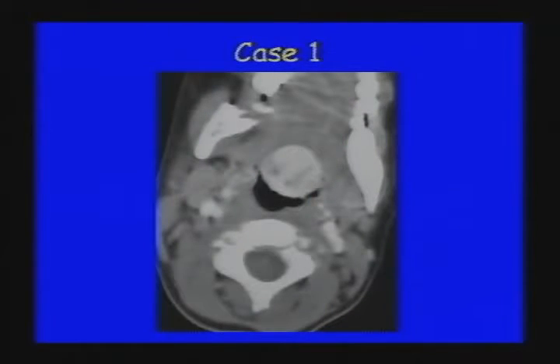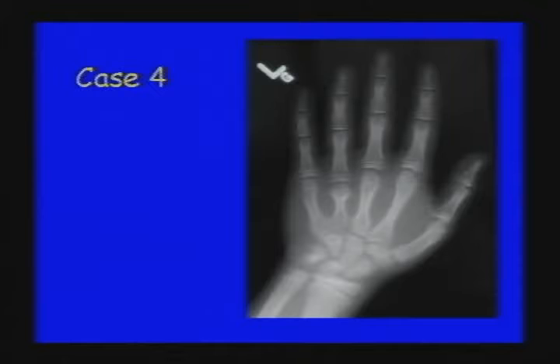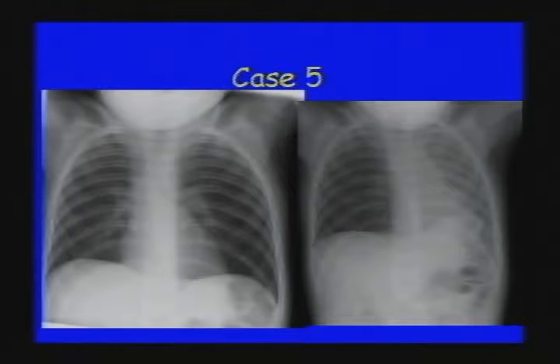Here are some unknown cases. Case number 1. Here's case number 2. Case number 3. Case number 4. And case number 5.